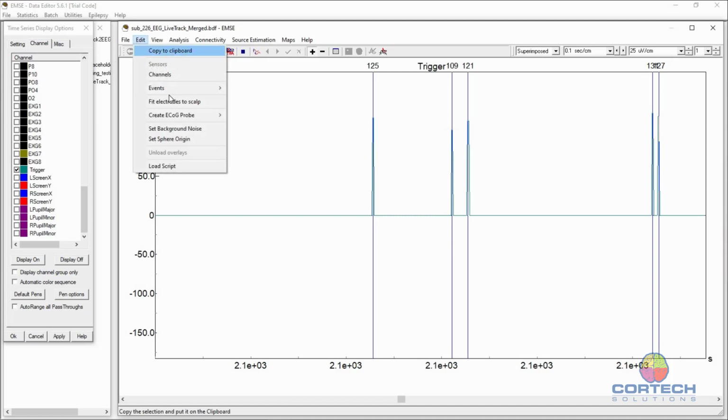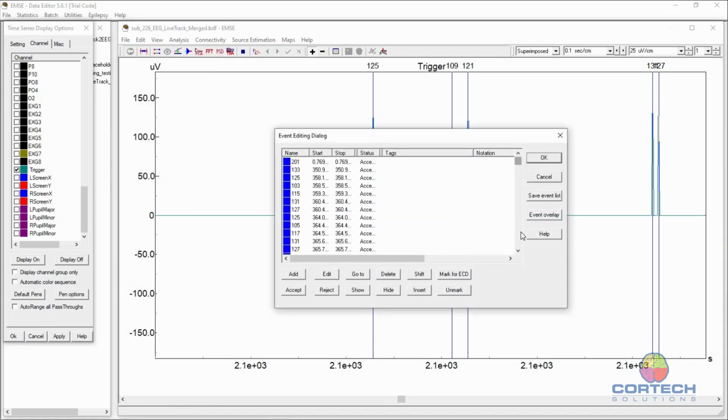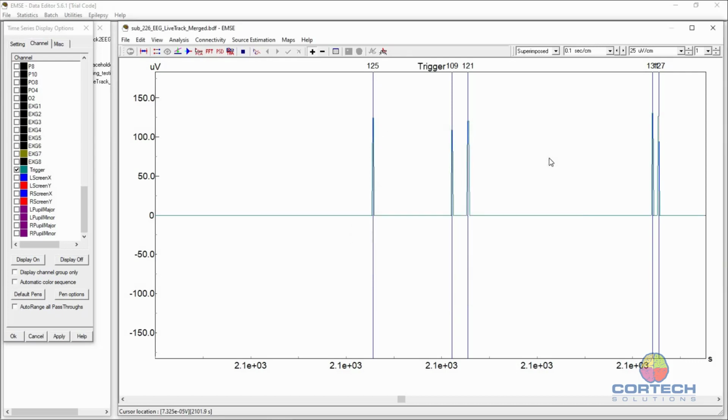Since this is a relatively long recording, we might want to go all the way to the end, or close to the end. Let's say out here. So now we're very close to the end of the data. Let's see if the alignment is still looking good out there.